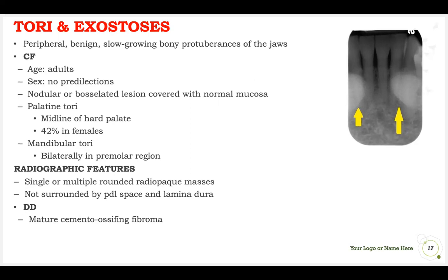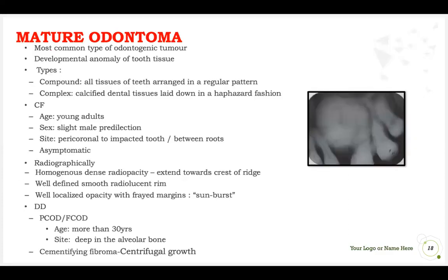Differential diagnosis, we should be able to differentiate it from mature cemento-ossifying fibroma. Mature odontoma is another type of radiopacity. It's a solitary radiopacity. Slight gender predilection in male. The most common site is pericoronal to impacted teeth.